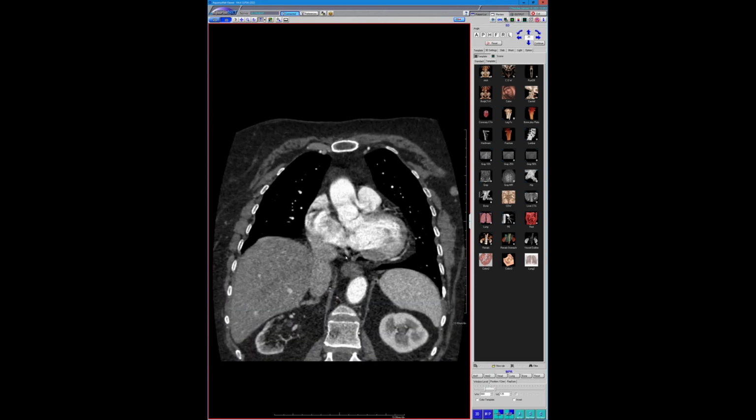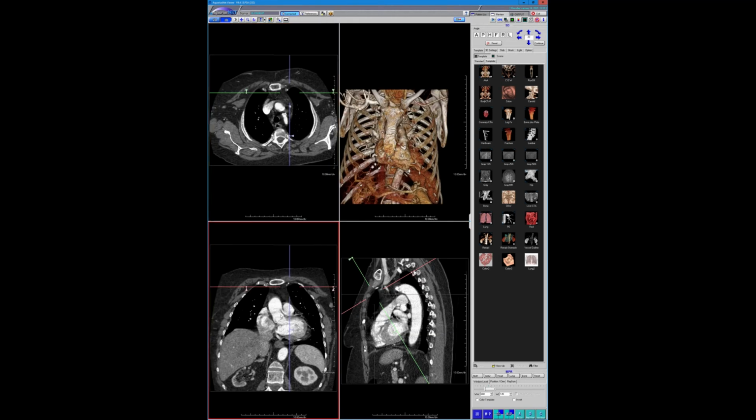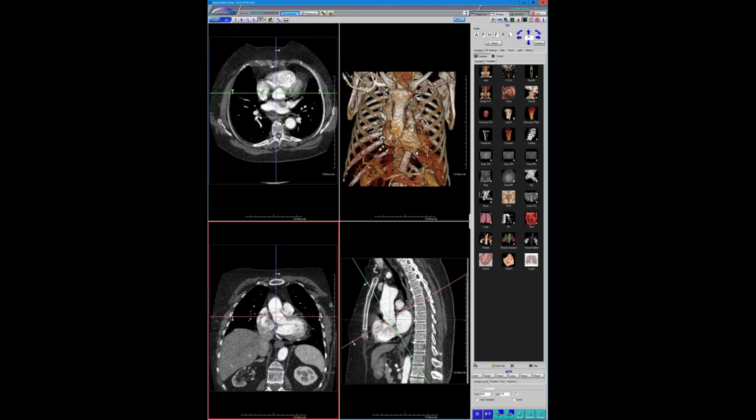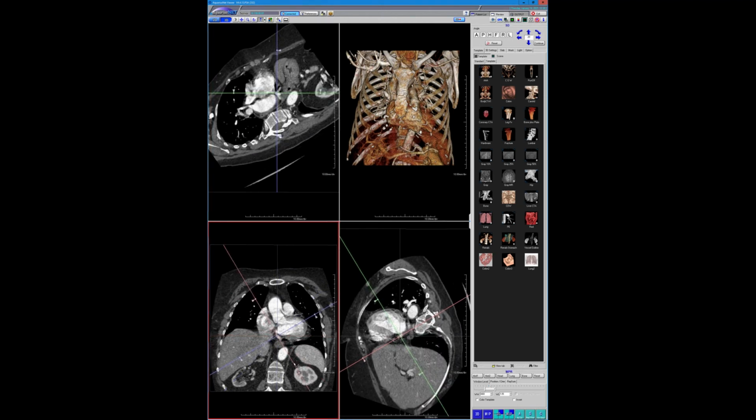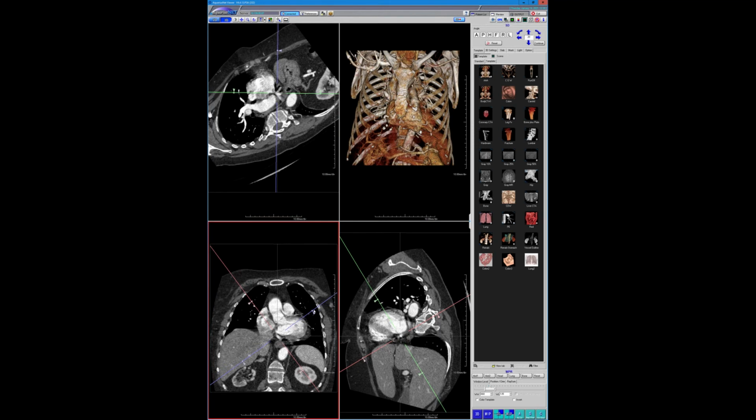So basically, it's ostial atresia of the coronary sinus with an anomalous venous drainage into the left brachiocephalic vein. And it's uncommon. It's not unheard of, but it's a nice, random finding on a cancer follow-up. You've got to make the cancer follow-ups fun somehow. I've shown a couple of those, you probably remember. And I still don't have one on a gated study. This is as good an example as I've seen.